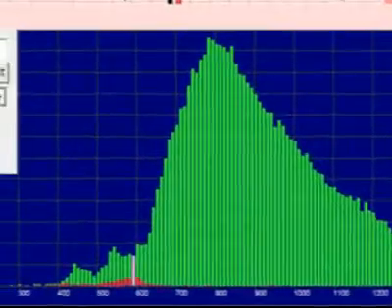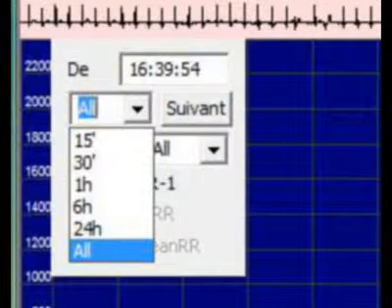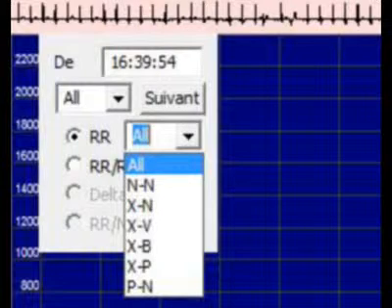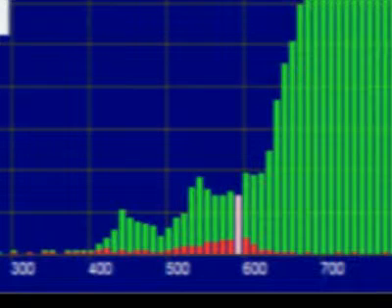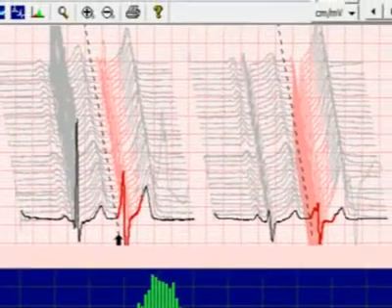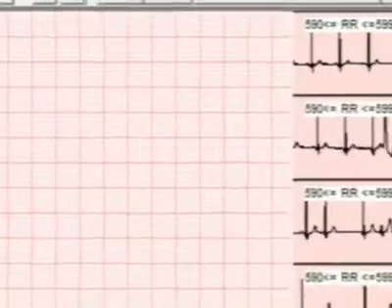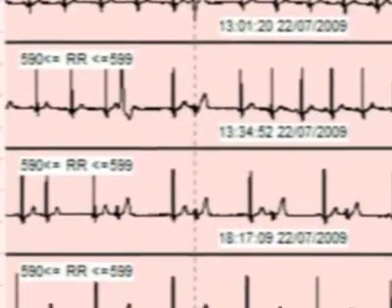By default, it presents recording data through the entire duration to perform global searches. You can choose a particular time period or view only certain types of QRS. In all cases, you can click on columns or drag a series of RR to see the corresponding QRS in 3D ECG and in the samples. The QRS can be relabeled if necessary.